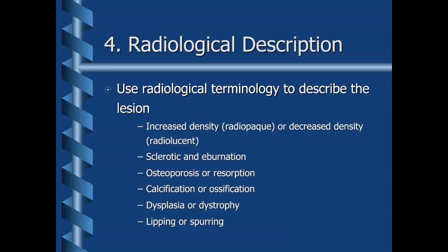So these terms are either increased density or decreased density, and you can use the terms radioopaque or radiolucent. So radioopaque for increased density or radiolucent for decreased density.